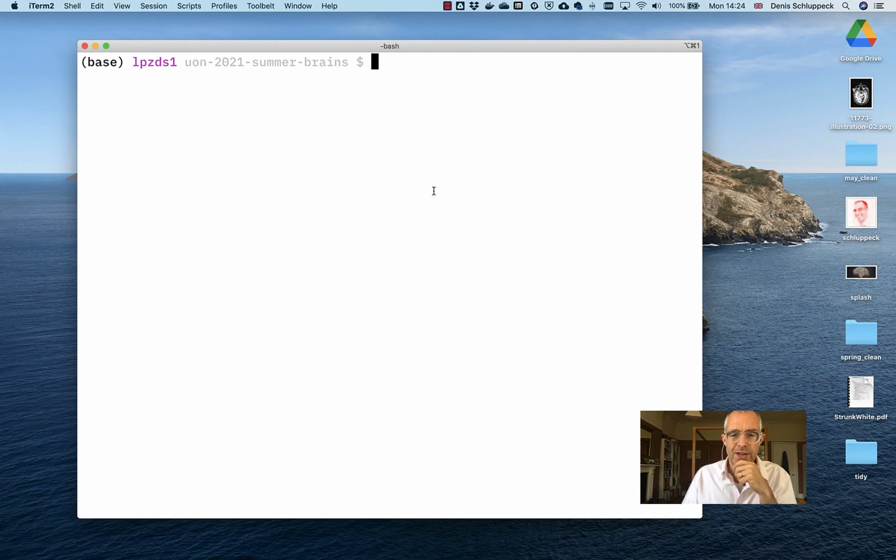Just a quick video to get started with these Julia notebooks and looking at some actual brain images. And so there's probably a couple of things that we need to make sure work on your computer as well. So I'm on a Mac here, but things should be very similar on a Windows machine as long as you have Julia installed and you have access to the internet.